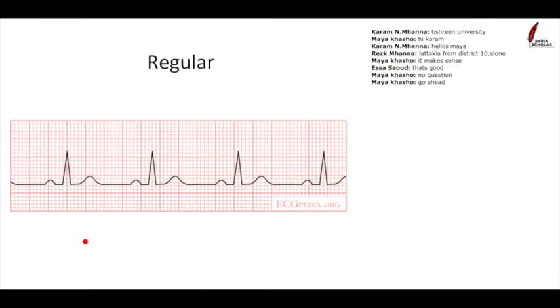So to start off with, this is a regular rhythm. There are basically 2 main regular rhythms you need to know. Can anyone tell me what rhythm this heart trace is in?